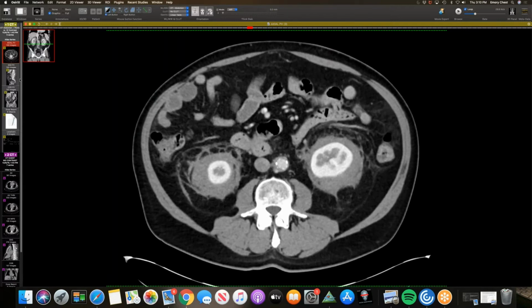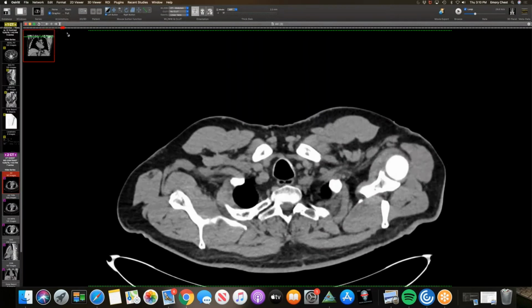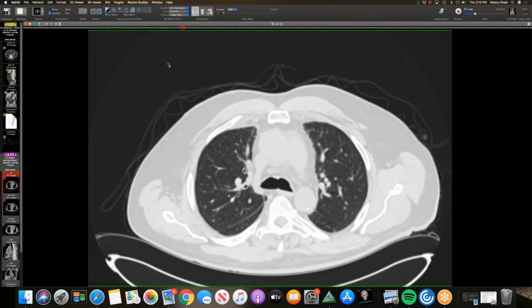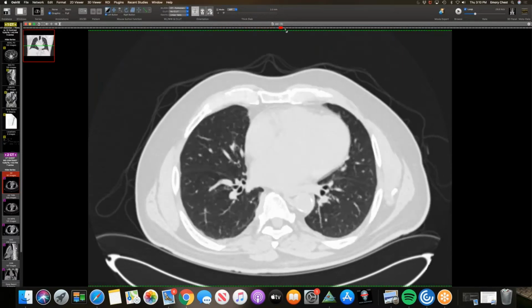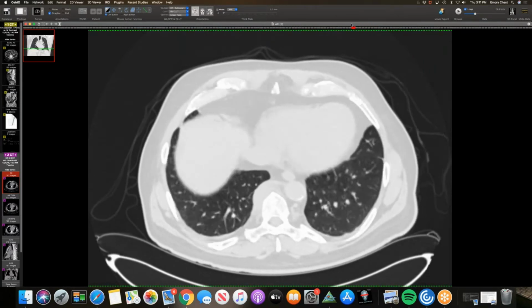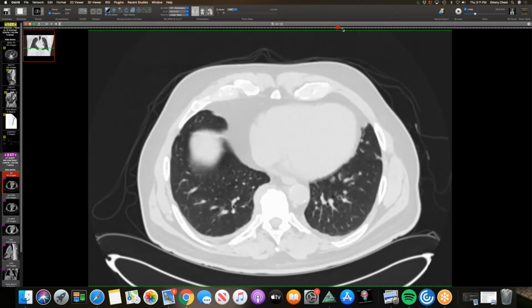Is there any lung or chest involvement? Yeah, I can show the chest. And I had a question about the aorta. I know there's some atherosclerosis, but did you guys think some of it might be aortitis and not just atheroma? You kind of showed a little bit on the abdomen. So we looked back through multiple older studies, and with aortitis, unless it was chronically inflamed, you would expect some change, but it was unchanged over many years.